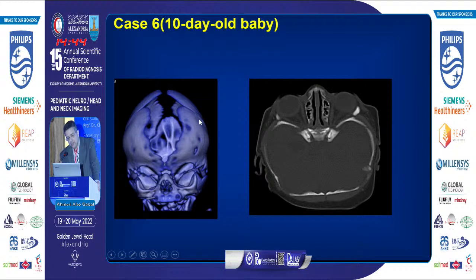Here, what we have is synostosis of the two coronal sutures. Whenever I have bilateral coronal synostosis, I have to suspect that this is syndromic. What are the other anomalies in this syndrome? We have oxycephalic configuration of the skull, elongation of the skull because of the coronal synostosis. We have shallow orbital cavities and bilateral proptosis.